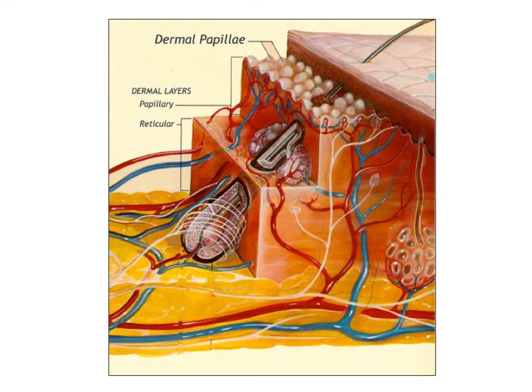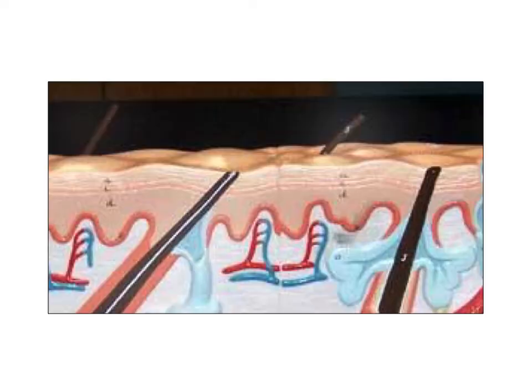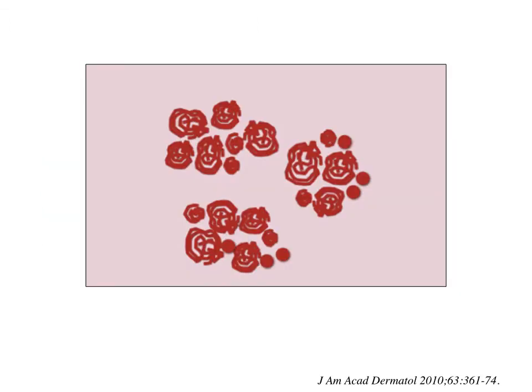The vessels we're going to consider in squamous cell carcinoma are the papillary vessels, but also the vessels of the subpapillary horizontal plexuses. Let's speak first about these vessels of the papillae. When the lesion is flat, and this is observed mainly in Bowen's disease, the papillae is seen from above. And this is why we have these glomerular vessels.